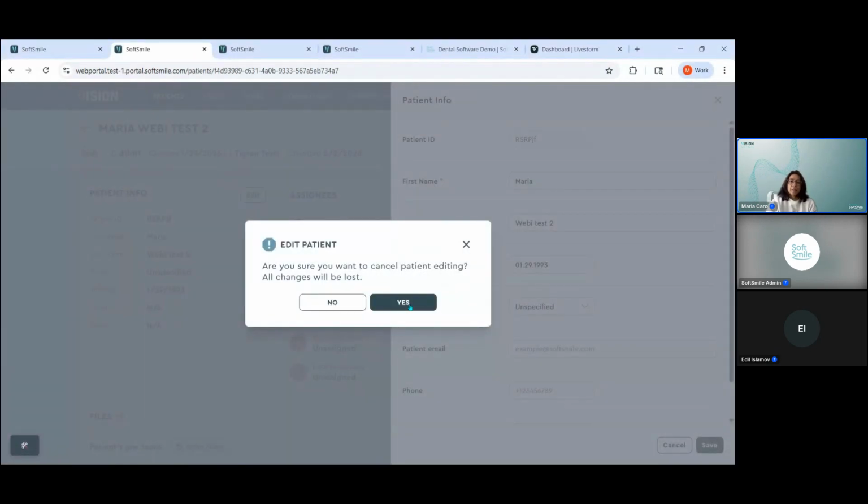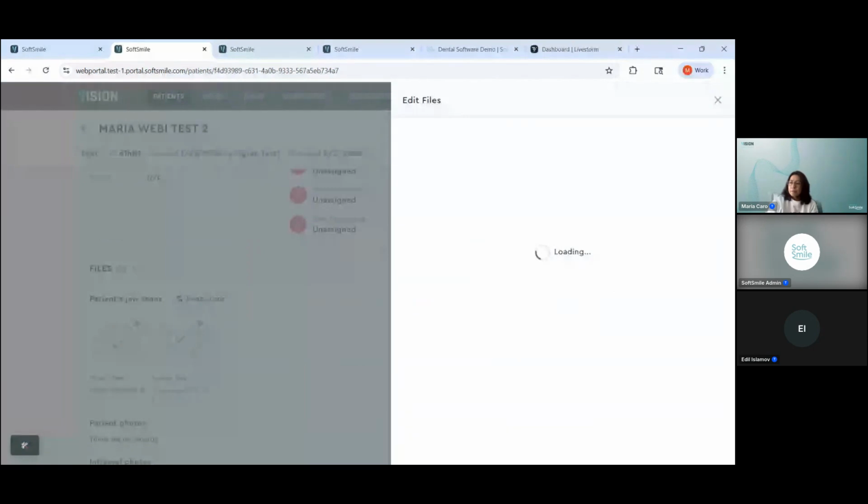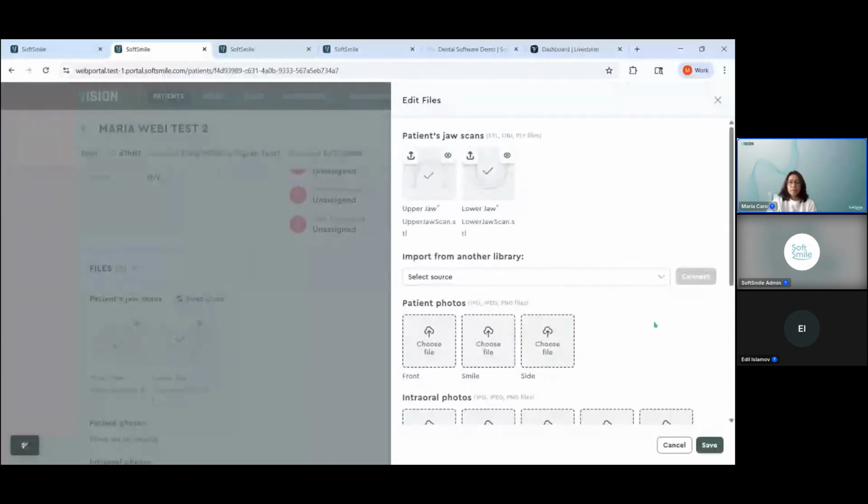And the next thing is when we're uploading files. We upload scans, but we also have the option to upload their images. For example, looks like I have a low quality connection. Sorry, it's being kind of restored as it goes. Hopefully you're not missing some of the things that I'm saying.